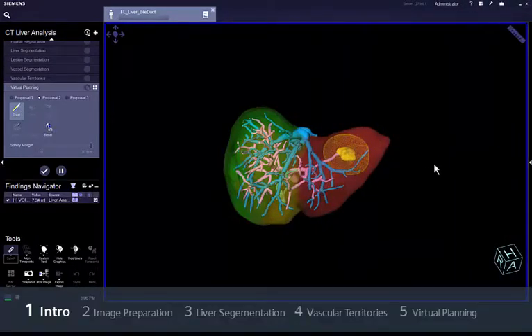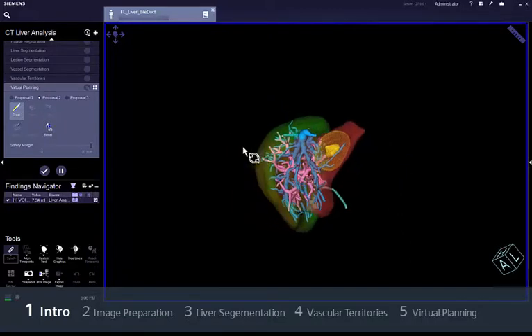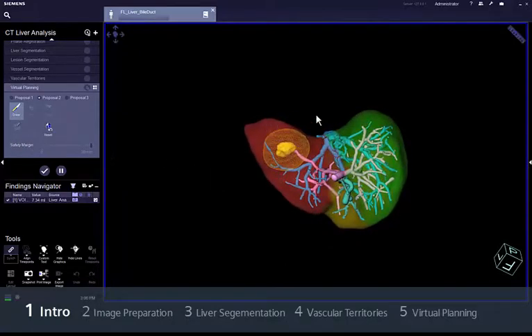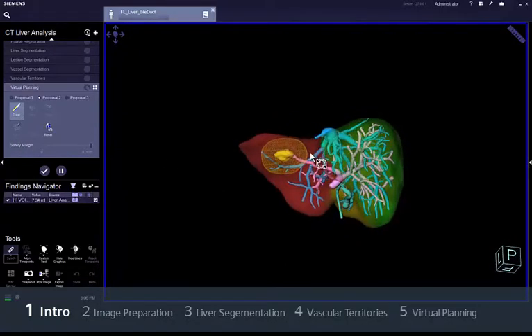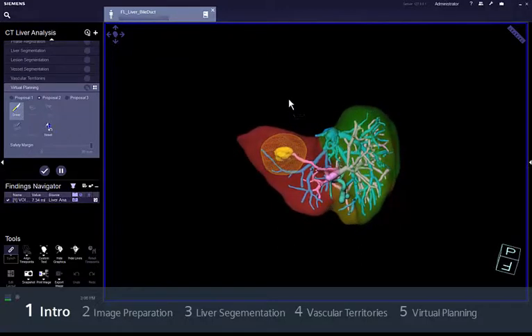When a decision is taken for oncological surgery, it is crucial to know the size and location of tumours beforehand. In addition, it is important to assess the amount of the resected liver tissue and to know about the vascularization of the affected liver segments. Syngo CT Liver Analysis provides you with a guided workflow for an in-depth analysis of liver volumetry.